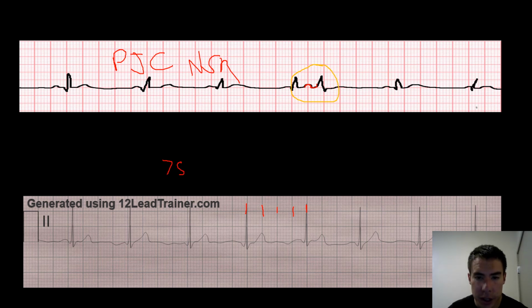Our P waves are, yeah, I think there is one in there. So it's kind of hard to tell. There's some weird, just random wobbliness, which doesn't hold any meaning in this, at least. But it does look like there's inverted P waves in there, because it could be a Q wave, but it's the way it's all pointy and weird like that.